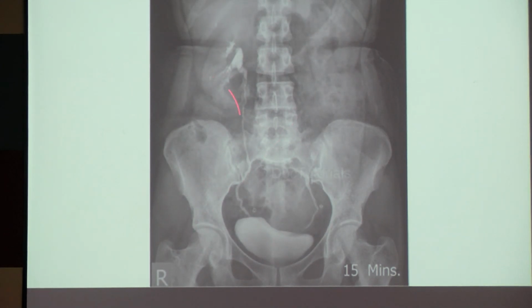Now, can you say what this is? We'll go quick. You can find there is a normal system out here, but you are not able to find a normal system out here. Is a renal agenesis taken place? No. You have to see the entire length, not only here. There is some line that has come here. That means this area has actually been overshadowed by the pelvis; it is having the pelvicalyceal system at this level.